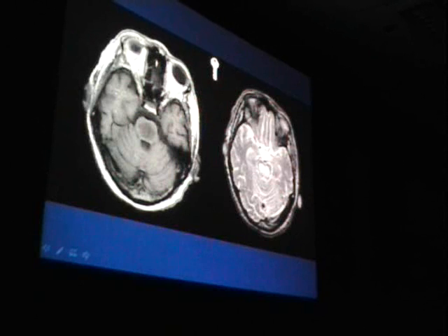This sparing of the periphery and the absence of pontine enlargement is the key to the diagnosis here, which is central pontine myelinolysis, more usually termed now osmotic demyelination, because the process can frequently occur outside the pons.